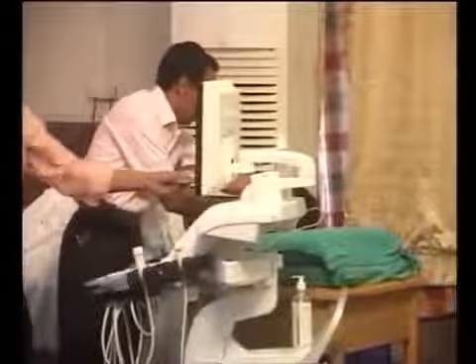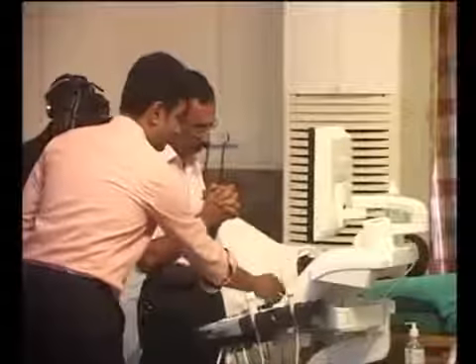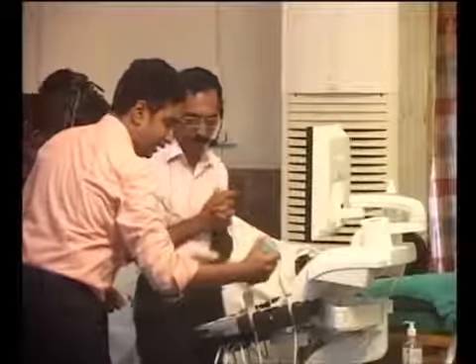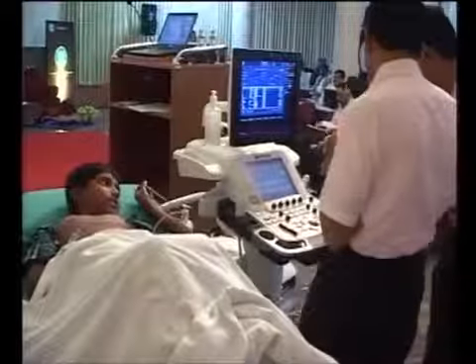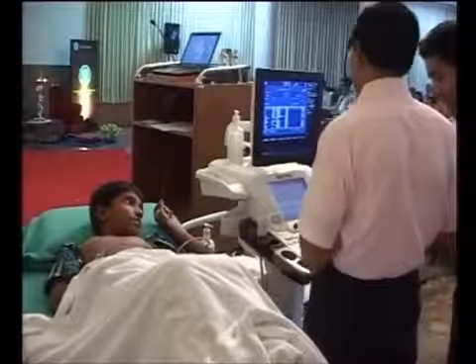How many of you predominantly do adult echo or practice in adults? Yeah, the trouble is in an adult with congenital heart disease. Sometimes you can have a lot of trouble because you may not get to see, for example, an ASD. That is one doubt or question which many people ask, if you have a big child or adult.